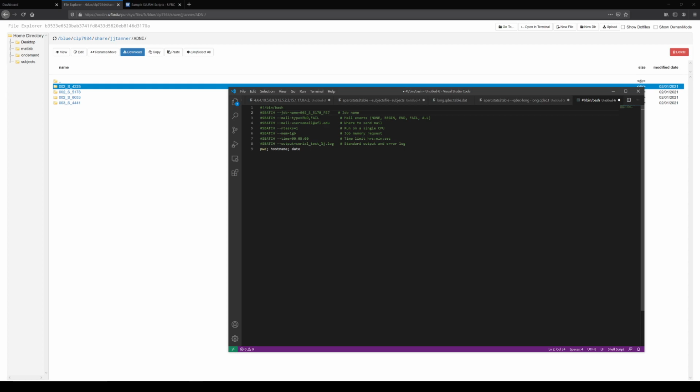And there were 2 ways we could write the script. So the homework assignment is to process 3 brains using FreeSurfer. We could put them all in one script, run one, then run the other one, and then run the other one. But that's going to take a while. If each one takes about 7 or 8 hours or 10 hours to do, multiply that by 3, and that's how long it's going to be running.